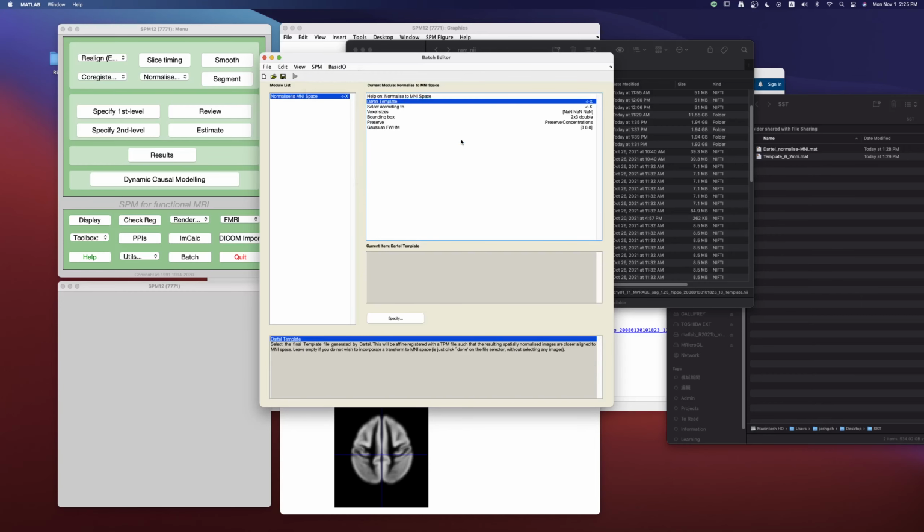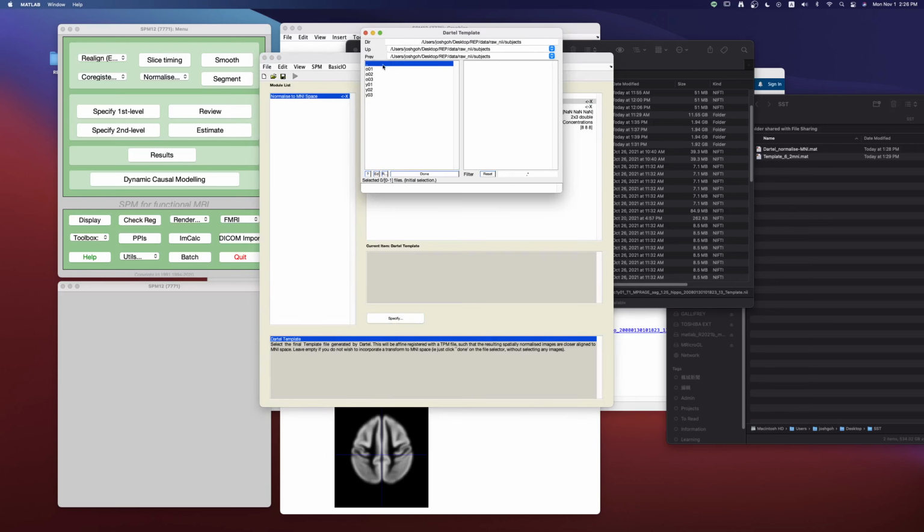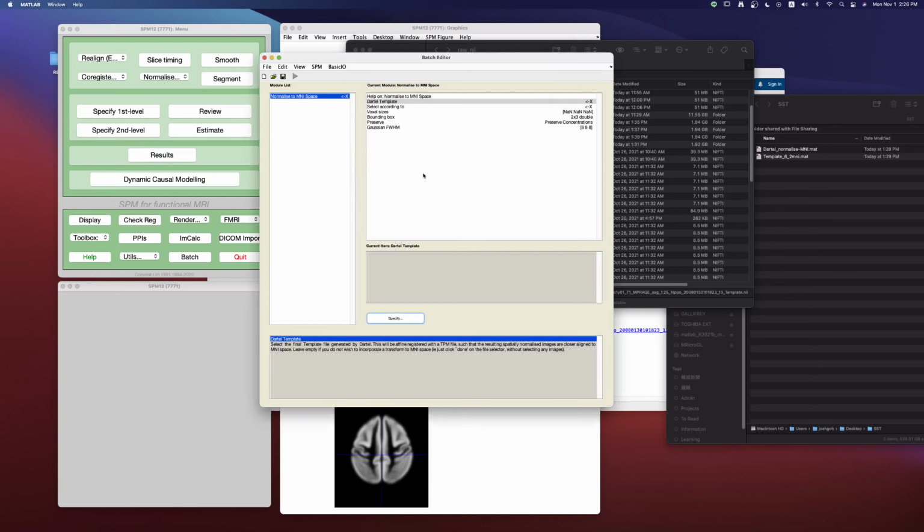It's really very simple. And here, you can read the help again in your own time, but we would have talked about this principle or concept in class, and here I'm just showing you how to do it using SPM. We go to the Dartel template, and we tell SPM where the Dartel template, the SST, is, so that SPM can move the EPIs to this SST intermediate step first. And as I said before, it's this Template_6. So we select that and put that here as the Dartel template.